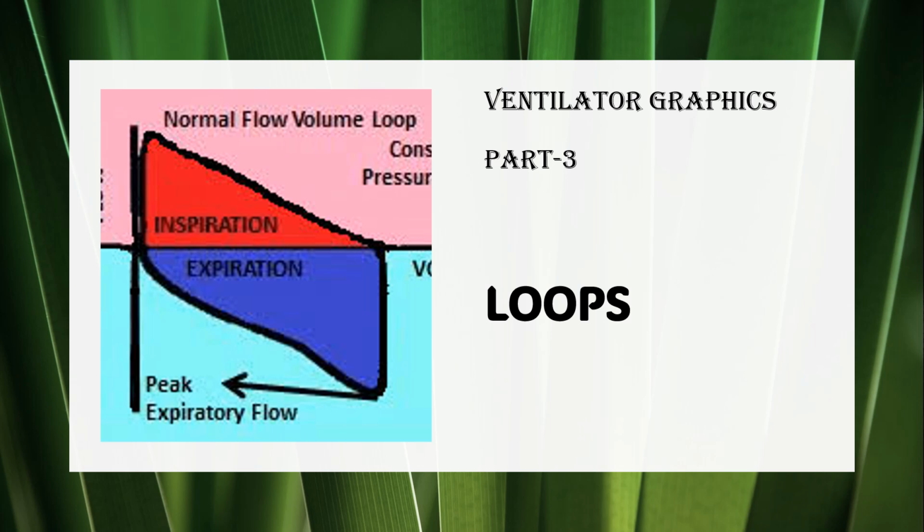Hello dear viewers, in continuation of this series on ventilator graphics, in this video which is part 3 on ventilator graphics, I will be discussing loops and their importance in the management of critically ill patients, those who are on mechanical ventilation. I am Dr. Sunil Garg from Essentials of Acute Care.